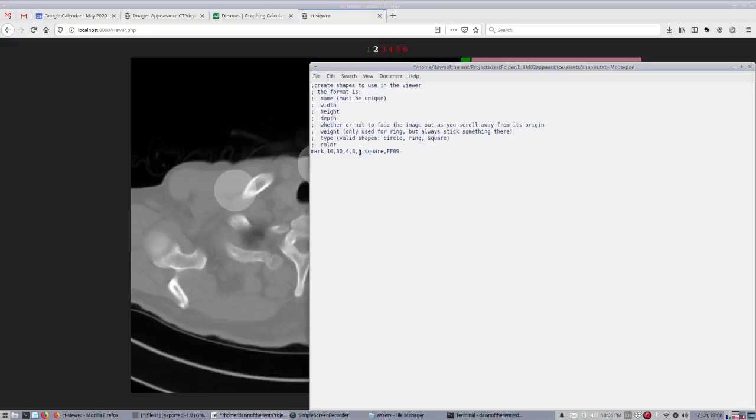Okay, so that T means that as we scroll, it will fade in and out. So it can either pop in and out or fade. Let's make another shape. We'll just call it test. And we'll make it a rectangle as well, but we'll invert its dimensions. And I don't know, let's make it blue. And I've been using the single hex digit precision, so let's actually swap it up and use 8 characters, which gives you more precision in your color if you want it.